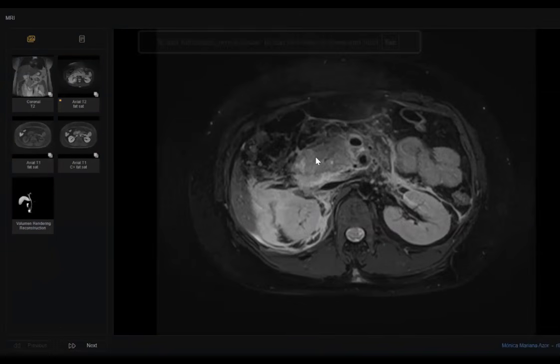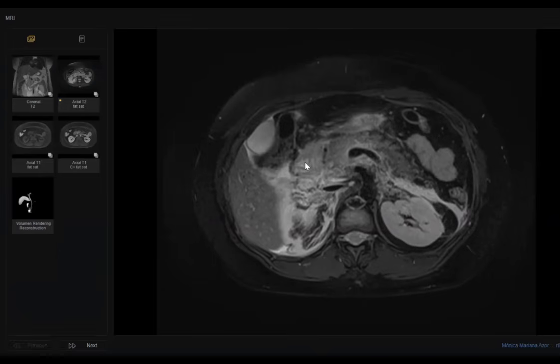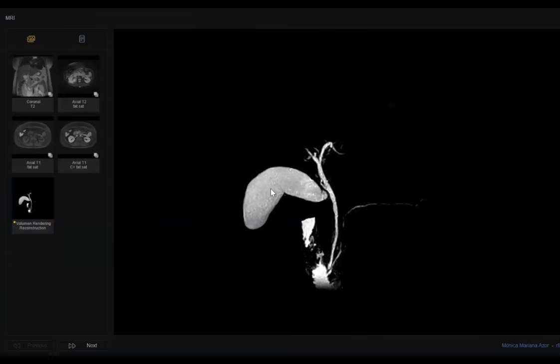Again, this is the duodenum. See, this is the pancreas here, and this is the duodenum. I mean to say this information in the case before: I talked about the importance of the 3D MRCP. Look at the duodenum, one of the most significant uses of the 3D is looking at the second part.